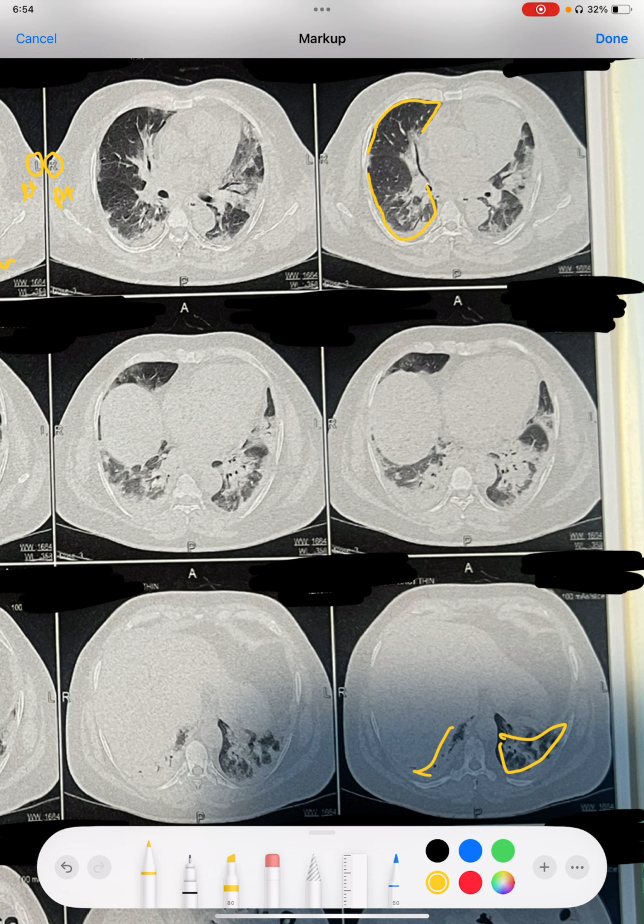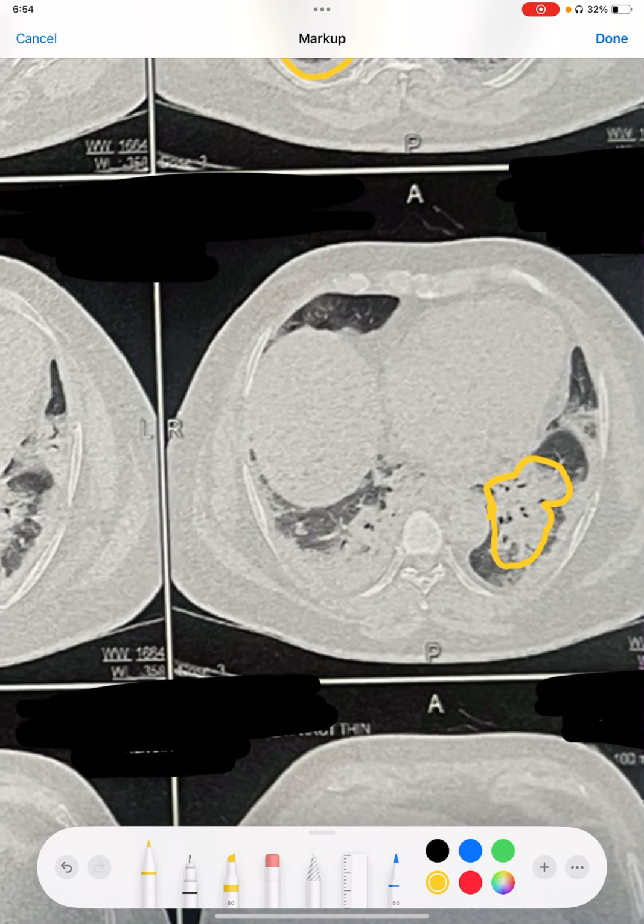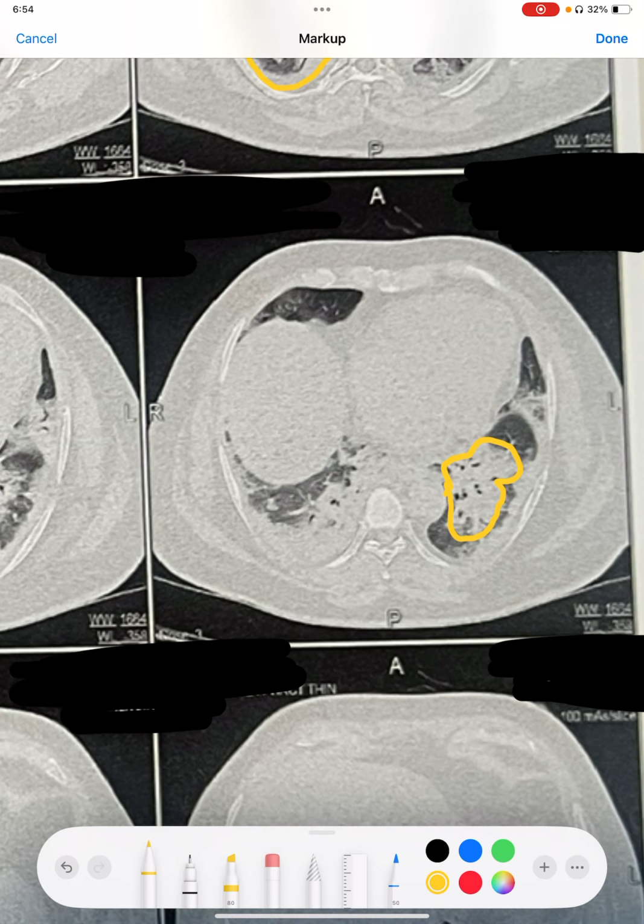So this is the lung, we know this is the lung. So there is a homogeneous patch. See this, we can very easily see. There is a homogeneous radio opaque patch in the lung parenchyma on the background of normal looking radiolucent lung.